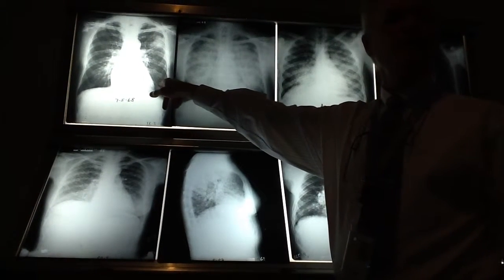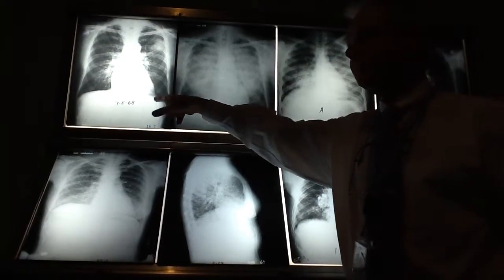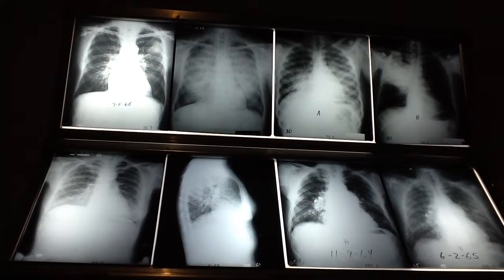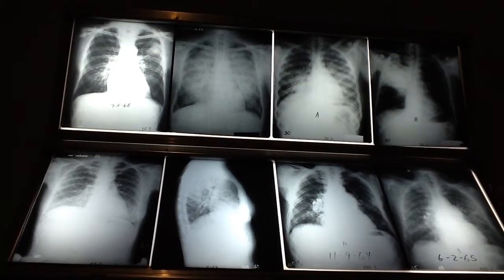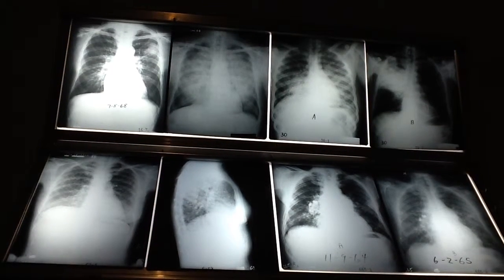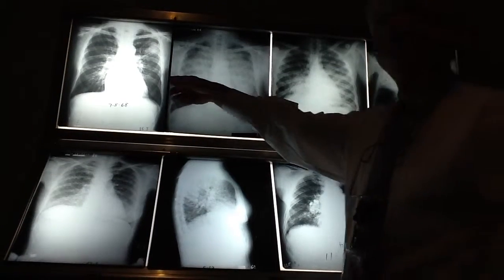Let's start with this one. Is there a density change? Yes. So the first decision is, how did the density change? Because when the lung's abnormal, the density, the shape, or both changes. If we've got atelectasis, that's a density and a shape change, isn't it? Density increases, the lung reduces in volume. That's a shape change. So what do we have here?